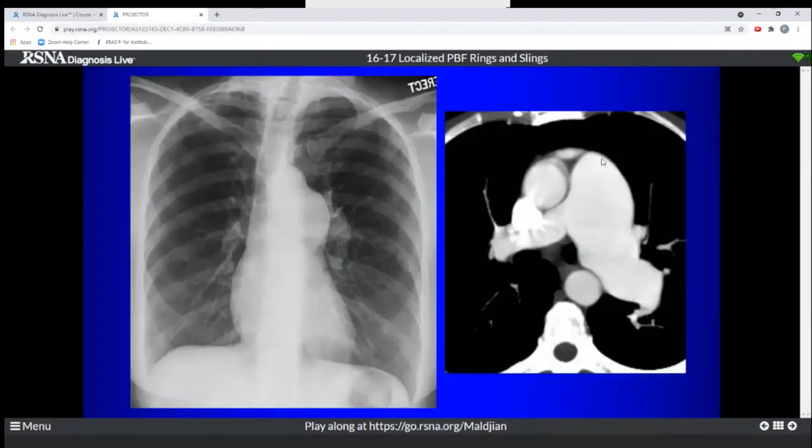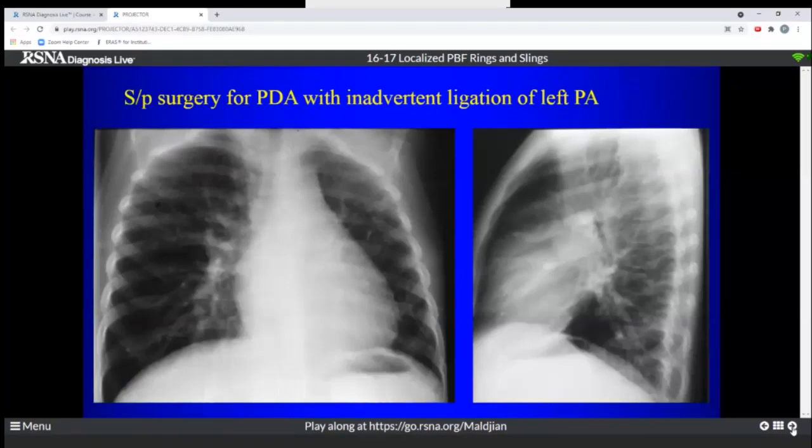The reason we get this configuration is that the left pulmonary artery is continuous with the main pulmonary artery, so the poststenotic dilatation extends from the main pulmonary artery into the left pulmonary artery. The right pulmonary artery comes off at an angle, so that is normal in caliber. You need to be able to recognize that appearance as pulmonary valvular stenosis.